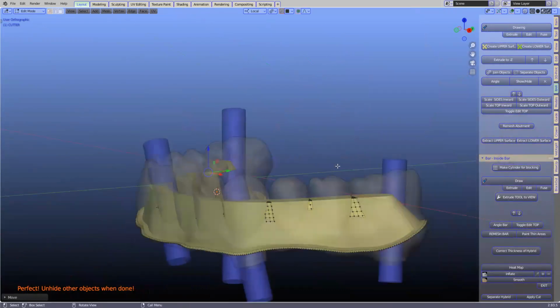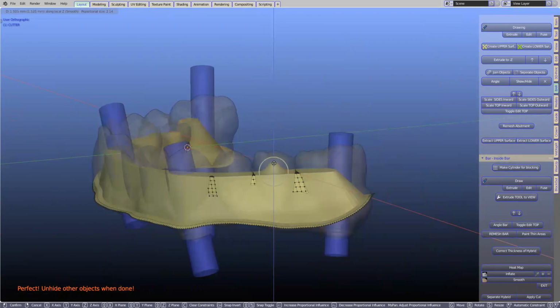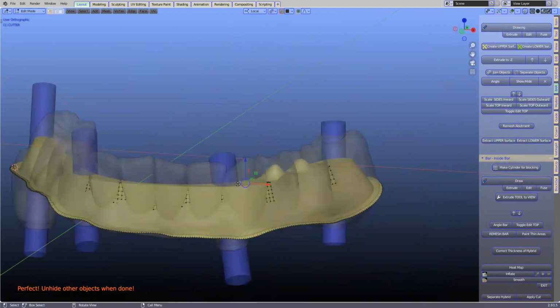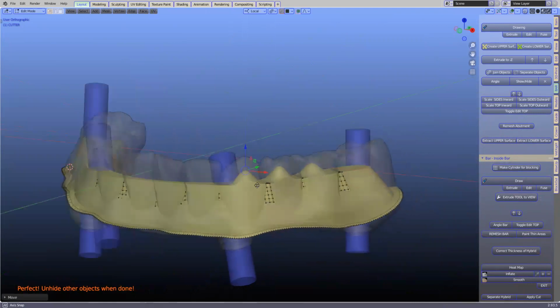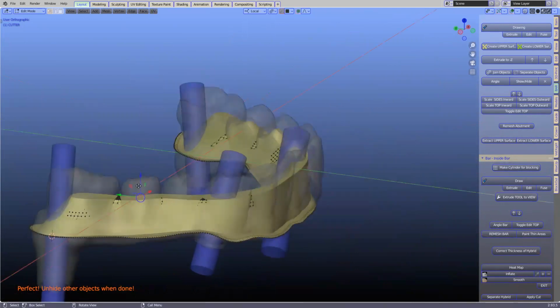And as I've said to you before, we can make additional retention. So GZ, let's just bring up like a divot into the tooth. Yeah, like up like that into the tooth, you know, for additional retention. So this is quite funky, I think. As long as you don't introduce undercuts into it. So it's just a rounded blob on top. Correct.